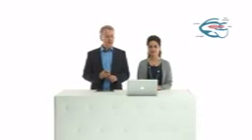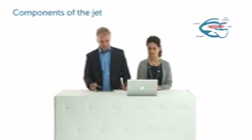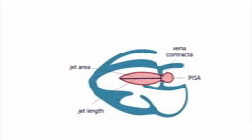I want to just come back to theory a little bit because I want to explain again the different components of the jet. Now, in aortic regurgitation, the jet would obviously be from the aorta down into the left ventricle, and classically you would speak of a proximal part right here. So you would have what we call the proximal flow convergence zone, and here, this diameter, where the aortic regurgitant jet goes through the valve, is called the vena contracta. And this vena contracta is probably one of the best ways of quantifying aortic regurgitation.